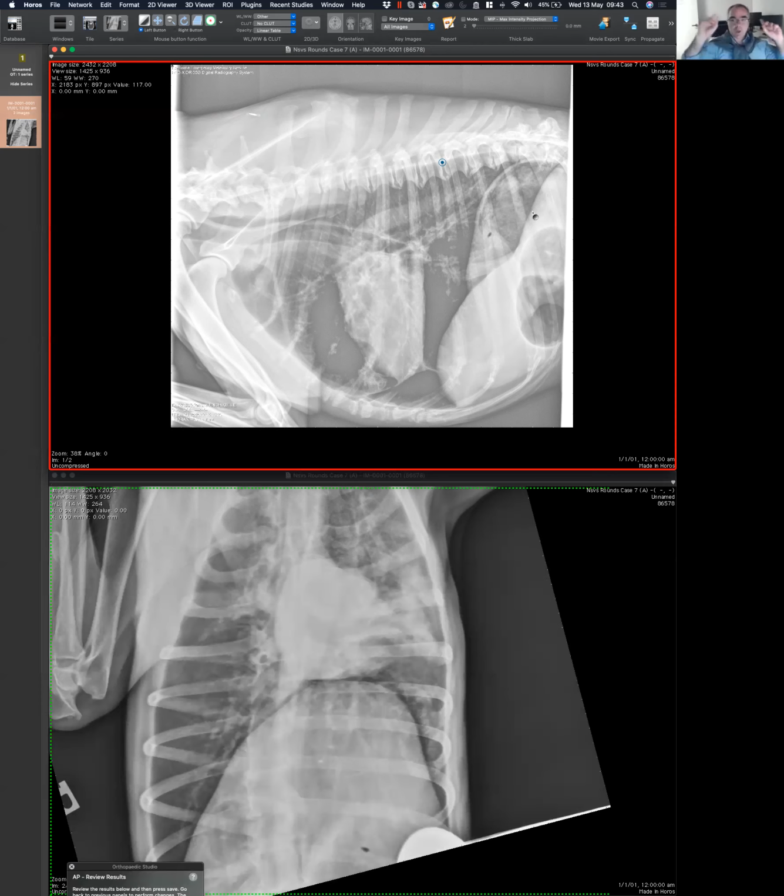So if you have these two statements, which are very easy to remember because they feel very natural, then the next thing we need to do is identify this as being right or left, or this as being right or left. Makes sense? Because if I can decide that this is going to be left, then that's it. This is a left lateral projection. So how to do that? We come back to the caudal vena cava. That's the caudal vena cava, and it's going beyond. It's not getting into this crus.